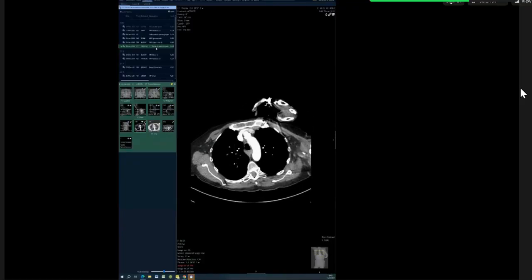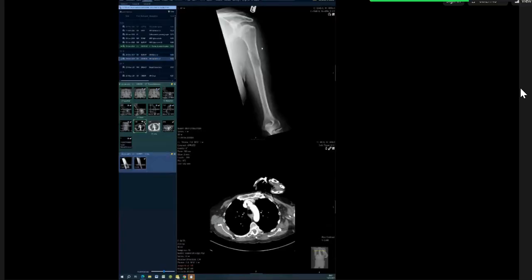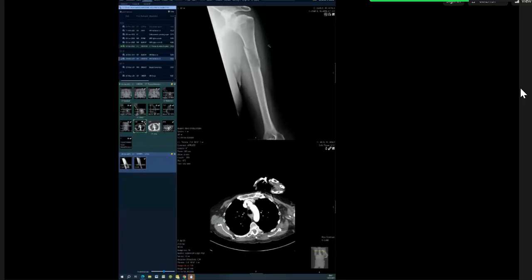We're going to go back to the bone first. Nobody's going to show you a plain fracture in a viva unless there was something special about the fracture management or the location of the fracture. It's not going to be a simple fracture. So if you pick the fracture straight away, you immediately need to start thinking about pathological fracture. They're showing you something about the fracture they want you to talk about.